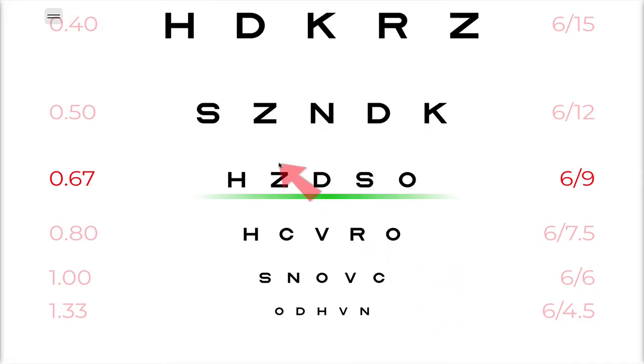Hi guys, this is just a quick tutorial to show you how to program your own custom sequences. A lot of optometrists have a sequence that they use when they test eyes, so it's pretty easy to record that sequence in Eyechart.online so that it makes the process even faster.